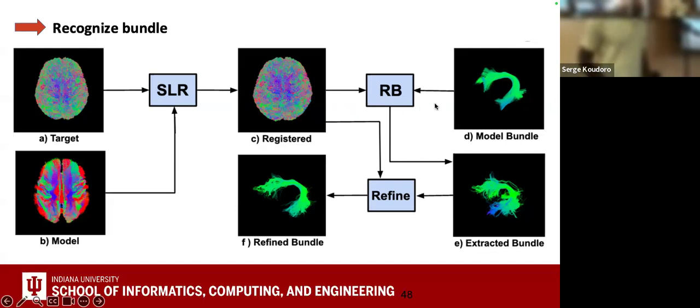It just takes the first track and starts to search using a classical distance function, trying to find which bundle in this brain is close enough to each of these tracks. When you get all these tracks, you get out a specific bundle. And then we have a function to refine, because some tracks don't mean anything and the shape doesn't make sense. So we clean our bundle to have the correct shape.